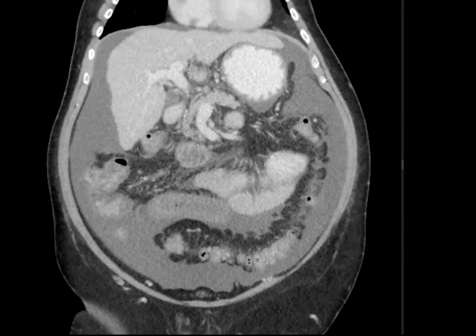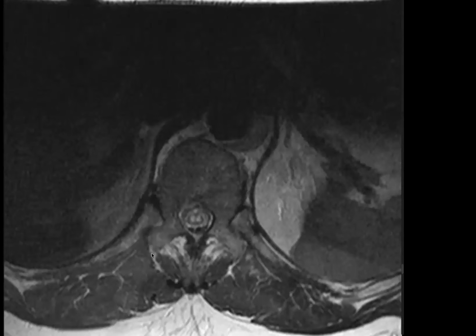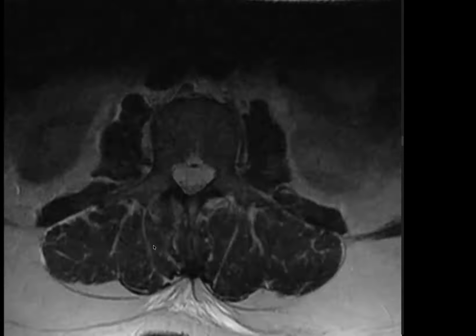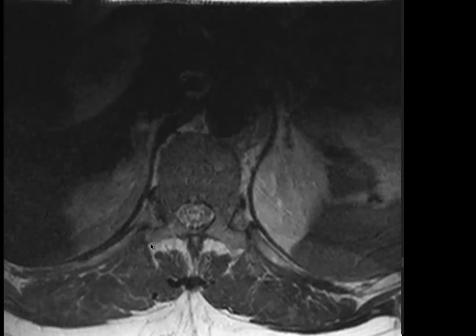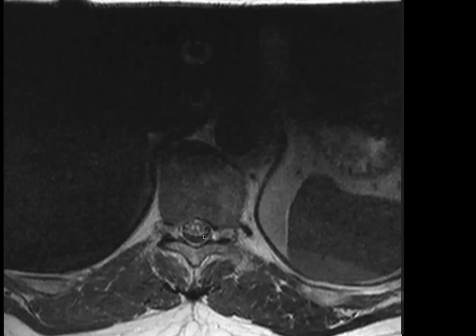Okay. Yes. This is where you started really well, and then you backtracked and you lost yourself in the discussion, because you immediately noticed the finding. You said yes, axial. You said that there is cord signal abnormality, and you even remembered and correlated with the acute presentation, and you thought of cord infarct, but then you didn't quite clamp down on it. So this is very classic.